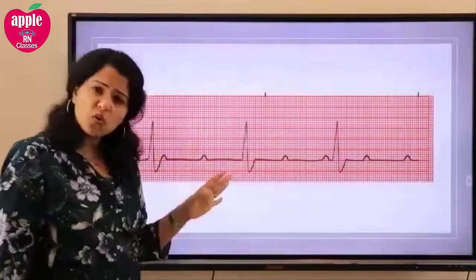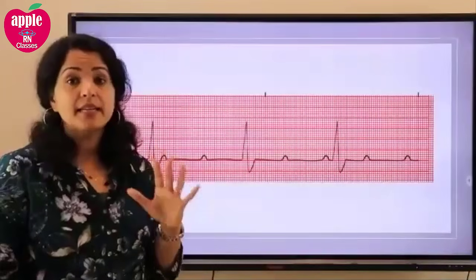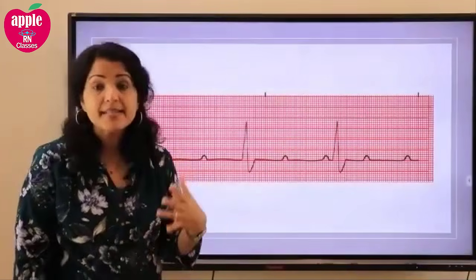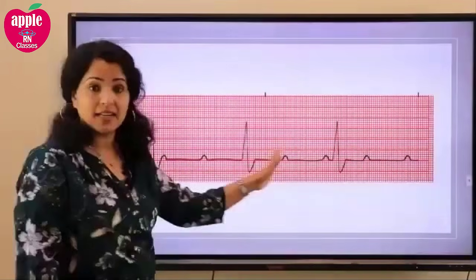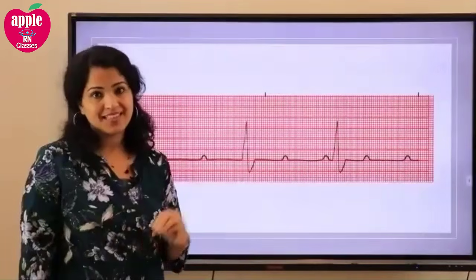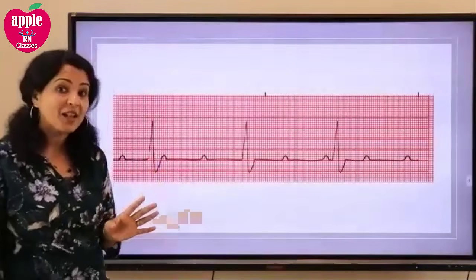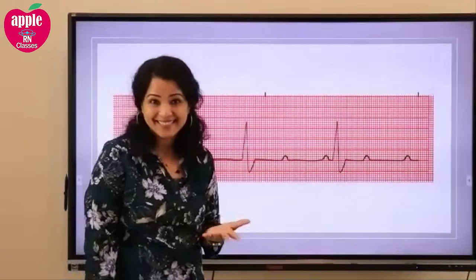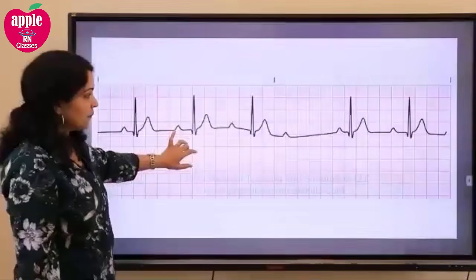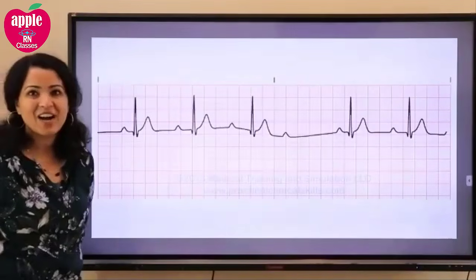And almost all the time, the third degree heart block is going to show you really symptomatic bradycardia. You can look at that, that's like bradycardia, and they will have symptoms. Symptomatic bradycardia, and that's going to help you a lot to understand that. All right. So that's the third degree. Now let's do some more. How about this one?